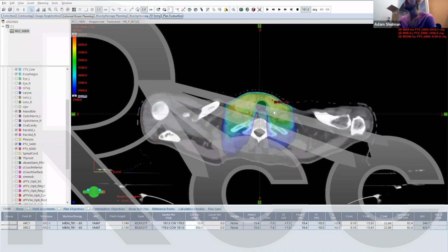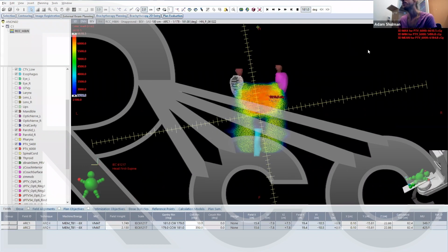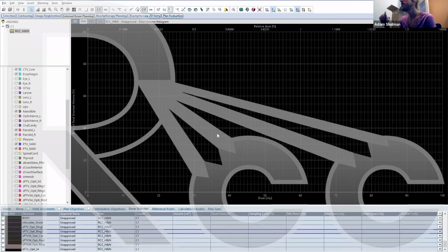So I think we've ended up with a pretty good plan. And I think if you end up comparing DVHs to any other planner that works on this, you'll see that your organs at risk sometimes have dropped by 10, 15, 20 gray, which is a huge difference. You'll be surprised, if you just let a friend plan it and then you plan it in this way, just how much your organs at risk have dropped. Any last questions? Thanks for staying a little bit over.